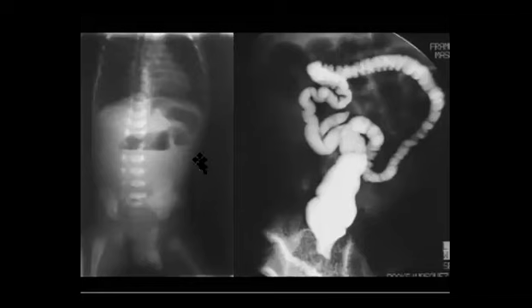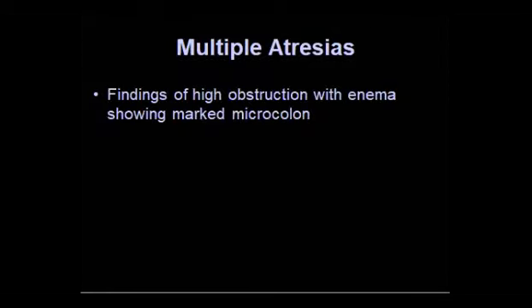So you remember the bubbles, it will be 1 or 2 or 3, maybe 1 bubble or 2 bubbles or 3 bubbles, maybe multiple atresias.